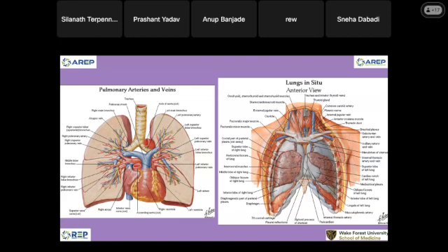Okay, for the left lung, we have two lobes. Compared to the chest radiograph, this is the upper lobe, and here is the oblique fissure, curving up to the lower lobe. Okay, here on CT, look at the anatomy of the vessels a little bit. This is the ascending aorta, and this is the aortic arch. Then the descending aorta is coming down here, on top of the spine.